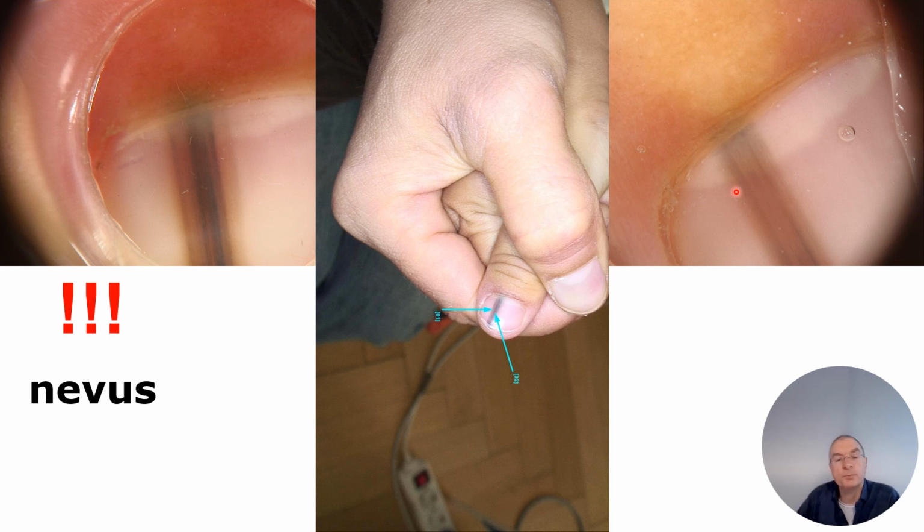But in the control it was less pronounced and the size had not increased. And what is the reason for this change? The first image, left-hand side, was taken in autumn, so after summer, after UV exposure, and this one was taken in spring, before sun exposure.